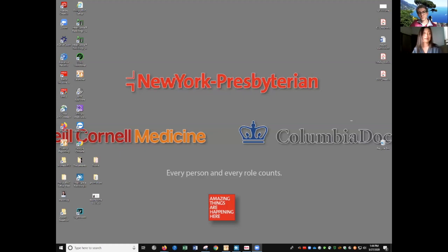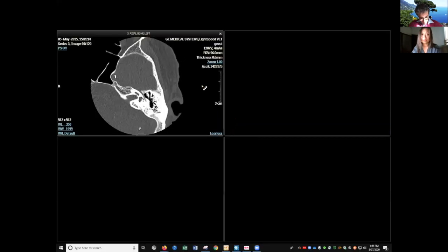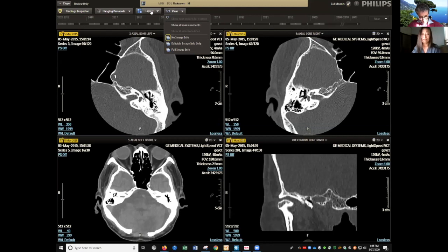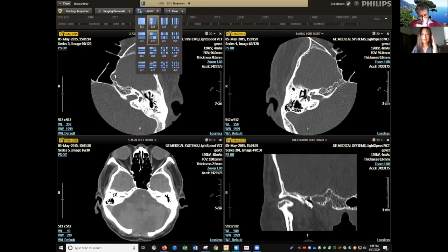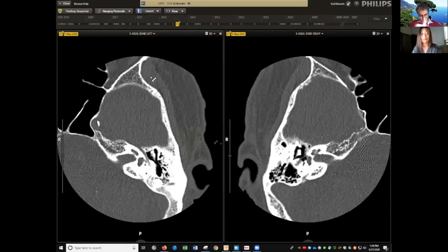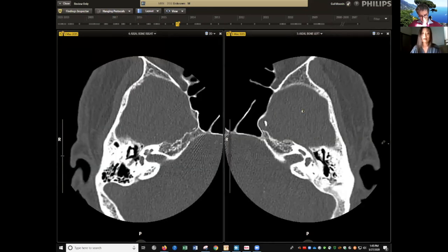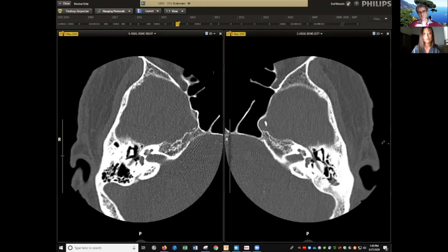Yeah, so I mentioned how with the destruction or even with the demineralization, it could be from ORN, but as I think I mentioned, you would see greater changes than just in the otic capsule. So the EAC frequently would be fragmented and tunneling. Those are classic buzzwords for ORN, the tunneling, the fragmentation, and the TMJ, the mandibular condyle, would often have some findings. So hopefully there would be some supportive evidence. But yes, ORN can certainly cause demineralization and erosion of the otic capsule.